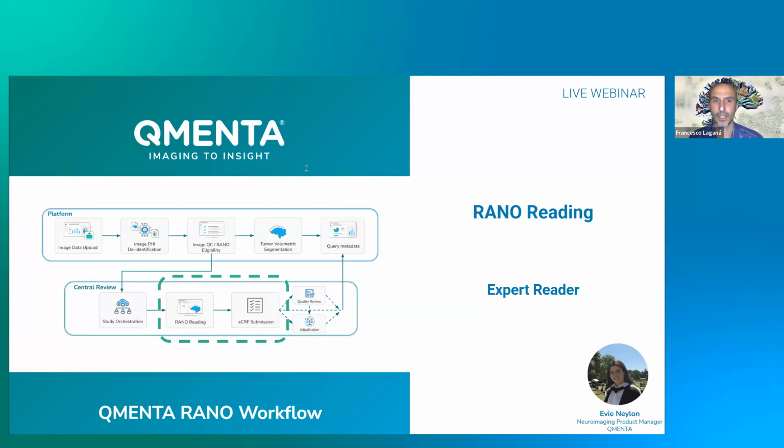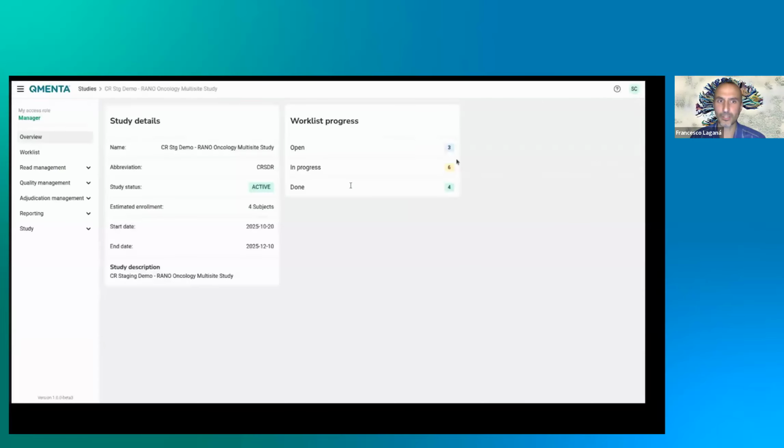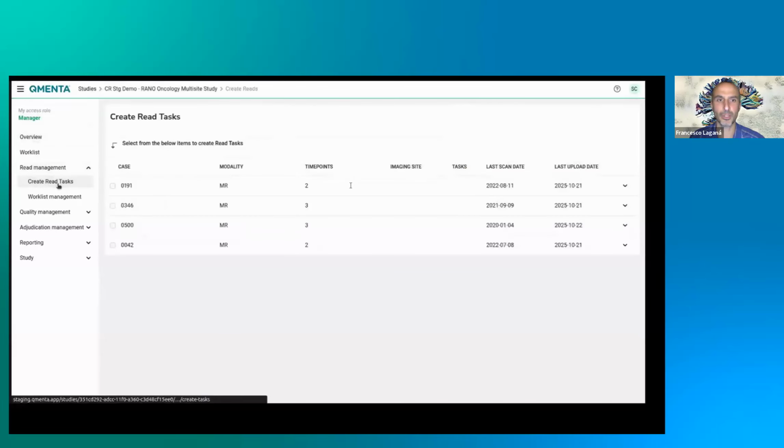Thanks, Evie. Now I'm starting to enter our central review module as a study manager. And my job, as a study manager, is to manage the expert readers and the tasks they are to perform. Our central review module is designed to make my job effortless.